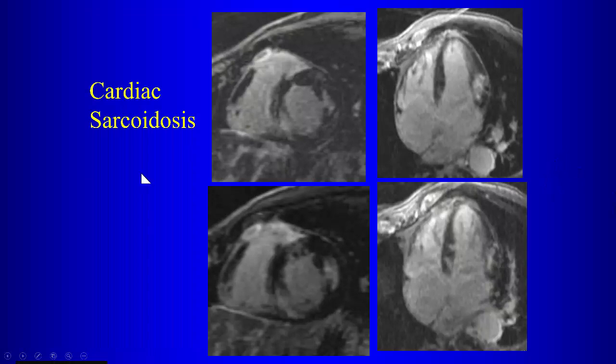Usually, if you're dealing with a test question, you won't have sarcoid and myocarditis in the same answer because the two can look very similar, right? They have similar characteristics on delayed enhancement, unless there's some history that can help you differentiate, or some other findings. Sometimes even on MR, you can see the lung findings associated with sarcoidosis.